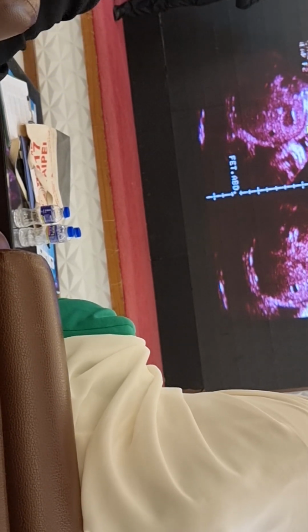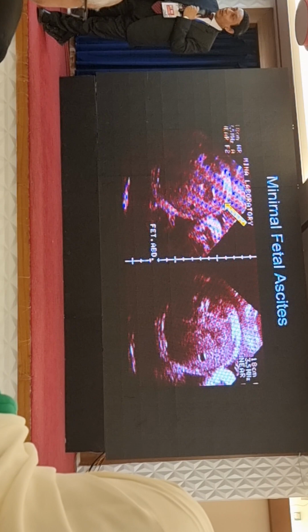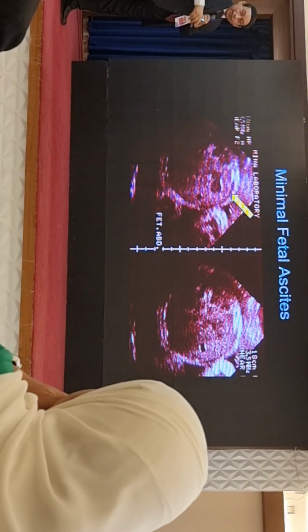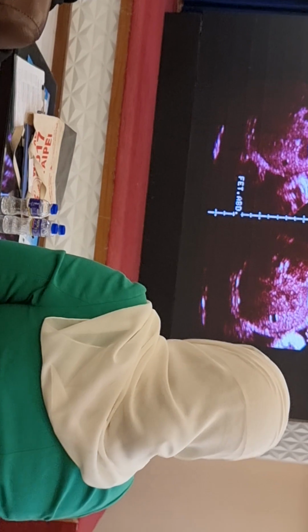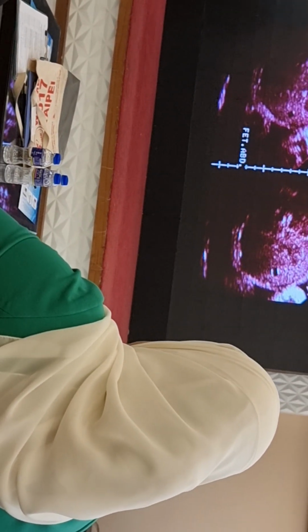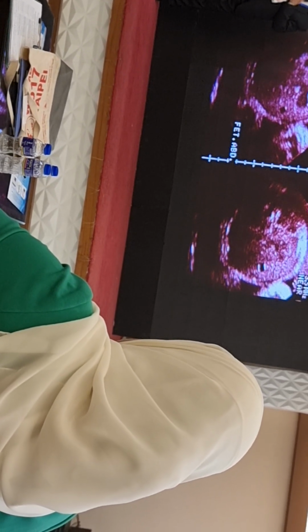Then I became worried. What is it? And I went through the literature. After searching so many papers, in one piece of literature I found that, yes, that can be a normal finding. What is it? This is a fatty layer inside the abdomen of the fetus. So we may get this. If we are very alert, then we may give some overdiagnosis.